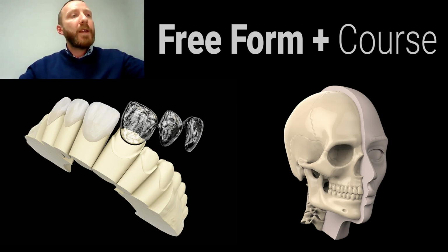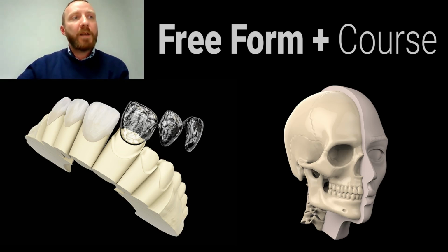So today we will have an introductory course, and I will show you the basic functions and basic tools of Geomagic Freeform design. I will show you how the interface works, how we can import the models, and how we can export the models, export with reducing and other functions.